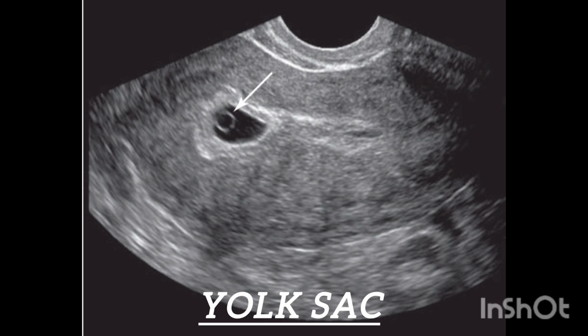As the pregnancy progresses, around 4 to 6 weeks, the yolk sac becomes visible within the gestational sac. This image shows the yolk sac, a critical structure that provides nutrients to the developing embryo before the placenta becomes fully functional. The yolk sac appears as a small, round, echogenic structure within the gestational sac.